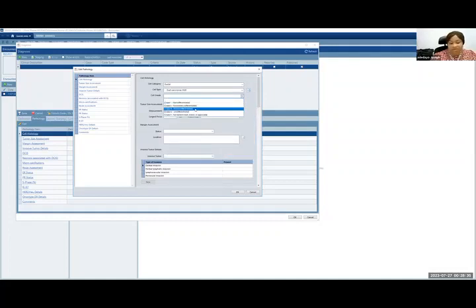So we'll have the grade from the pathology biopsy report. Is it a grade 2? Is it a grade 3? If it is not stated, then we have to pick grade X, not determined or stated or applicable. Once you leave this place blank, then it is possible it is a grade 2, but you just forgot to fill it in. Or it is a grade 4 and the person just forgot to fill it in. So it's important to say that it's not stated if it was not stated.